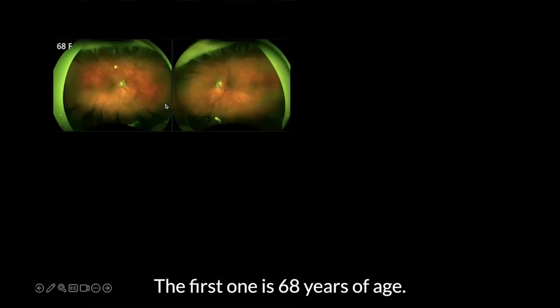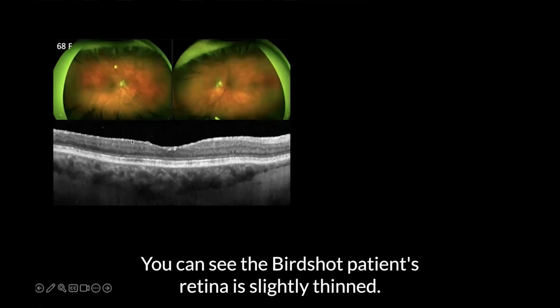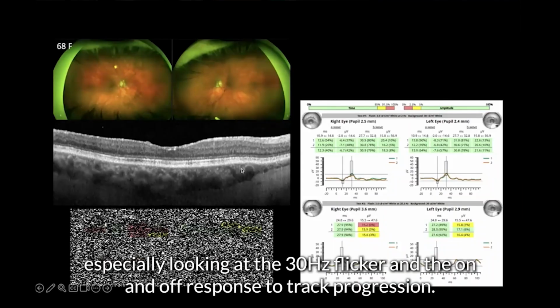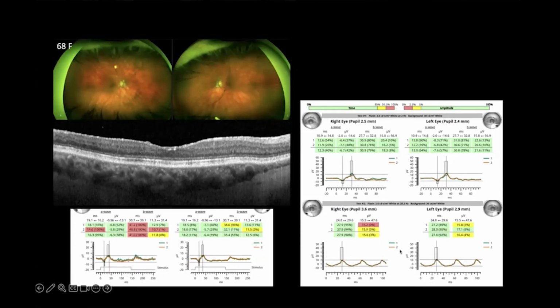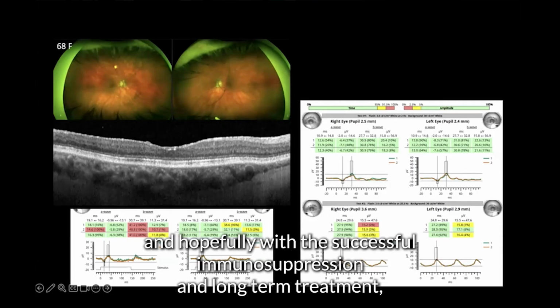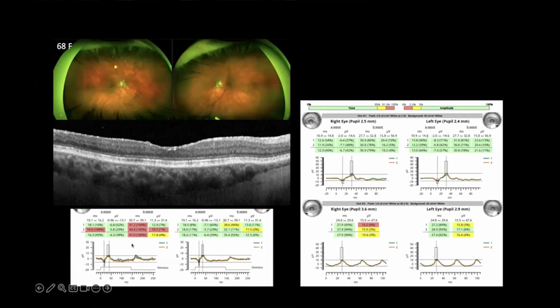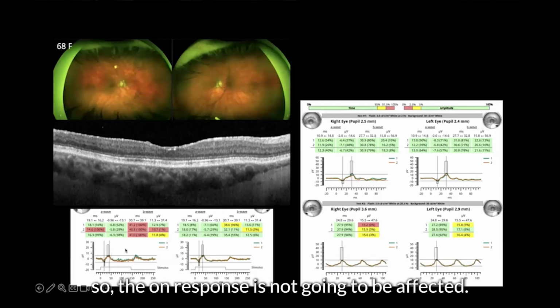These are two patients. The first one, 68 years of age. You can see the birdshot lesions. Retina is slightly thinned. And we like to use RETeval, especially looking at the 30 Hertz flicker and the on and off response to track progression. She's been immunosuppressed, and hopefully with the successful immunosuppression and long-term treatment, her peak amplitude here in the right eye is not going to decline any further, and the B wave amplitude is not going to drop any further. So the on response is not going to be affected.